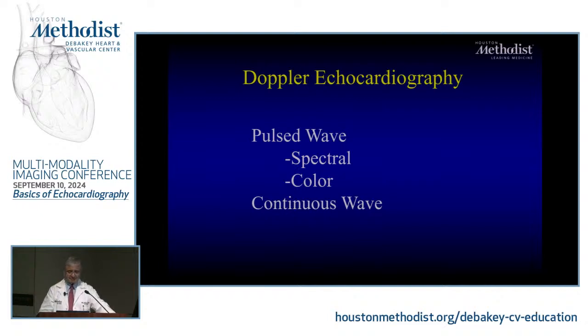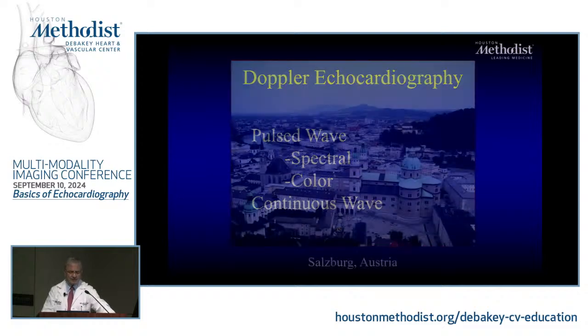Not that hard. Now, under pulse Doppler, color Doppler is actually under pulse Doppler. You don't think about that, but it is a modification of the pulse Doppler technology. And then there is spectral, where you usually put your sample volume and you see an aortic flow and a mitral inflow, et cetera, et cetera. So let's go through them.